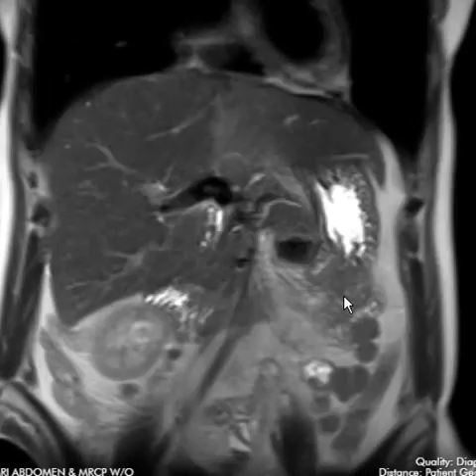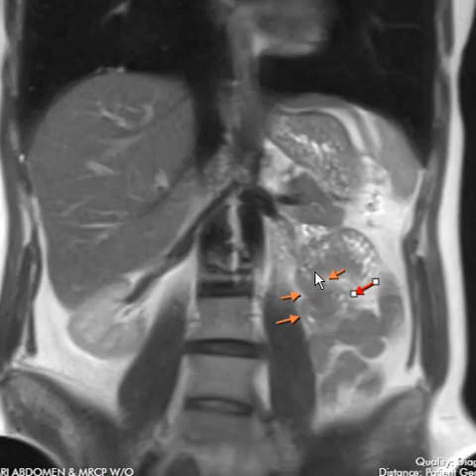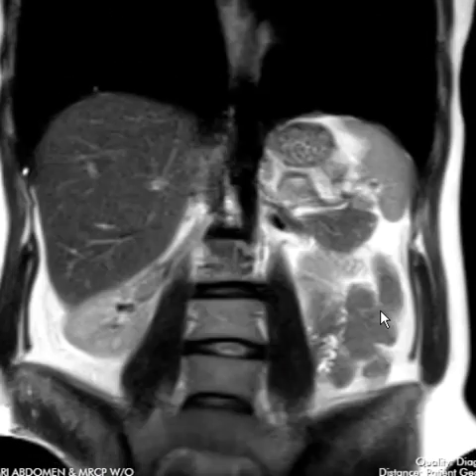In the left abdomen, on one of these views here, we see something strange. It looks like there may be an intussusception. Looks like a bowel loop comes down, and it looks like it widens up here into an intussusception possibly. Pretty hard to call on this, but you can see it narrow here, maybe widening here and here.